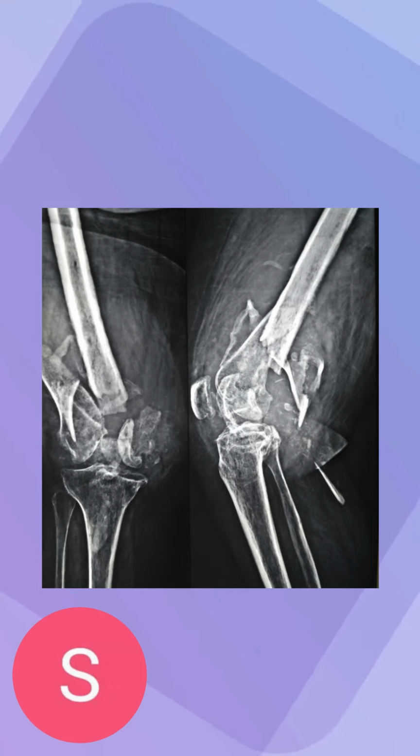So I want to give you guys a few seconds to analyze the picture, understand what's happening, and come up with what exactly you think has happened. Like, what do these bones tell you? I'll give you guys a quick second. All right, if you want more time, go ahead and pause now.